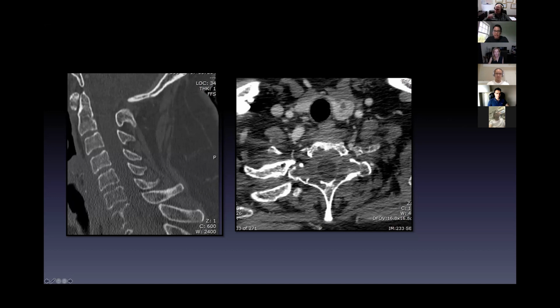So let's see, any takers on what we think the underlying pathology is here? I think that's what you were getting to before, right, Wendy? While you're thinking for a second, that's my job: I got this tumor first. The patient came in with symptoms. I told you what levels are involved, what it's doing to the canal and to the cord. It's compressing the cord. There was no cord signal. On here, I'm showing you the osseous characteristics, and I'm going to give you a differential, but we're not going to do that yet. Radiology's second job, my job, was that this came to me for biopsy, so I could give you tissue before we take this to tumor board and proceed with the decision.